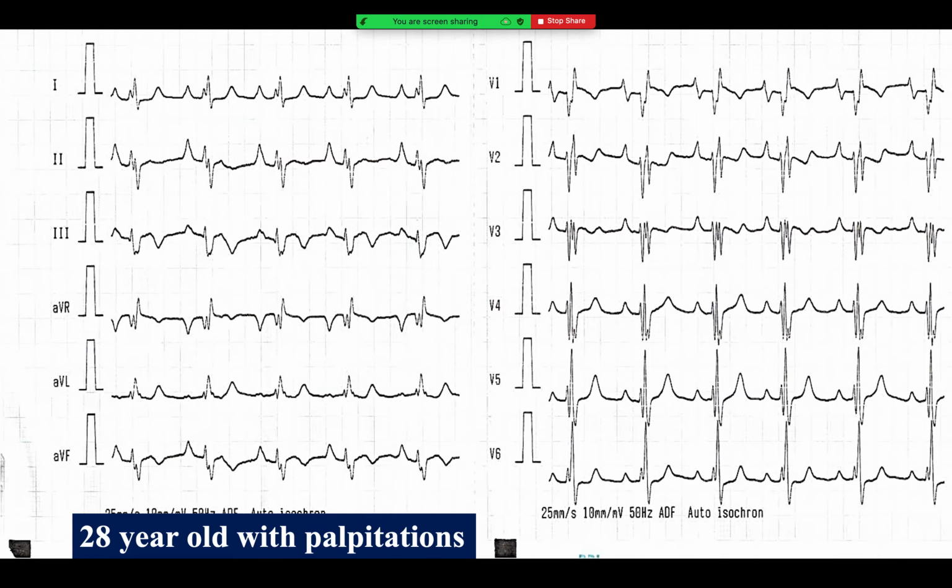They are very tall but widened as well. So, what are these called? Himalayan P waves. And there are multiphasic, low amplitude, bizarre QRS complexes with multiple deflections. Yes, and you do notice prominent Q waves in the right precordial leads, which is again characteristic of Ebstein's anomaly.